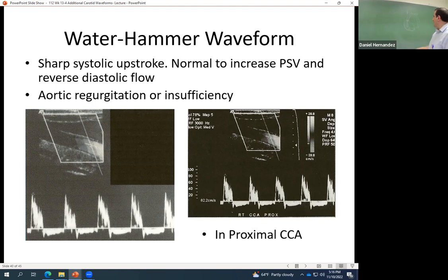Yep, so patients who have severe AI, when that valve should be closed, if that AI is considered severe, you'll wind up during diastole, when that valve is closed, getting blood flow retrograde, going back up the aorta around that arch through that valve. So it's enough to pick up holodiastolic flow reversal in that descending thoracic aorta when you guys are doing echo. And then it's enough to pick it up in our CCAs as well. So during that diastole period, we're getting retrograde flow coming back down our CCAs on both sides into that aorta and through that aortic valve.